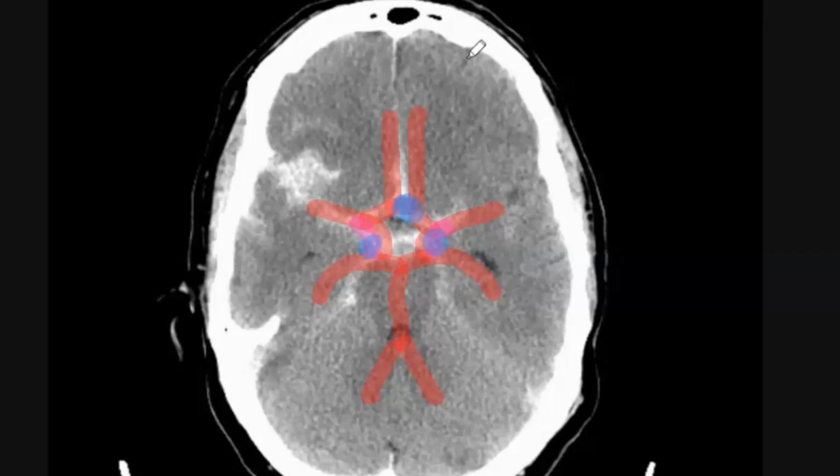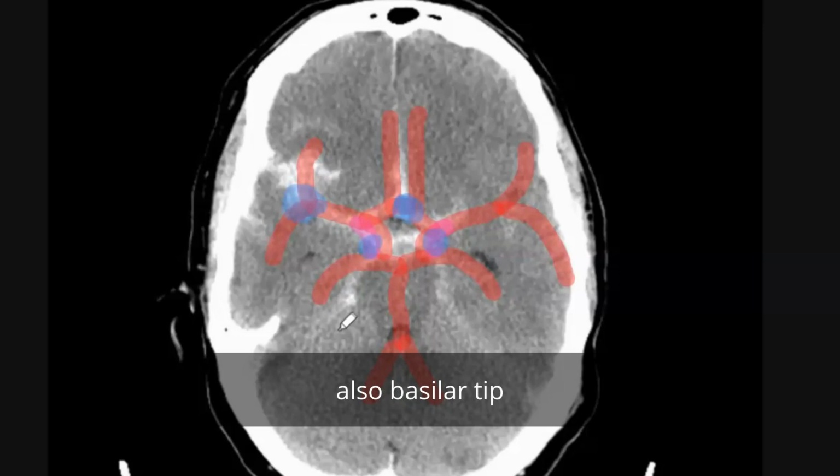So these are places to look for aneurysms. The other bit that can happen is when you've got vessels which are branching. So your MCAs branch out here. So anytime that blood's going to run into a brick wall, what happens is you can get aneurysms forming there. So this patient's going to have an MCA bifurcation or trifurcation aneurysm here. And that's interventional neuroradiology, Albie, isn't it? It's done. Done and dusted.